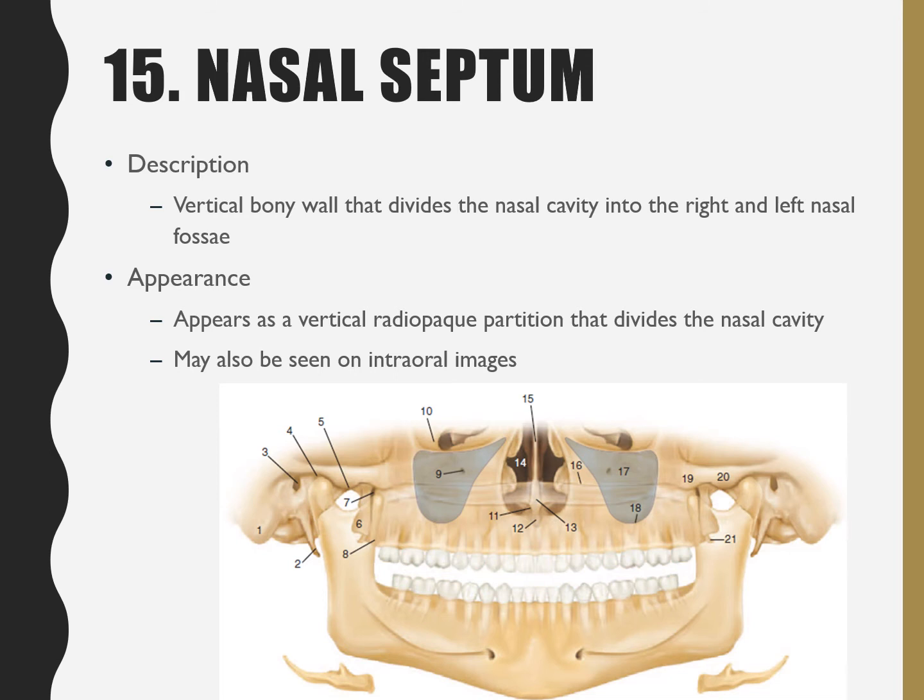Sometimes when you take a panoramic, this nasal septum is not always going to appear perfectly straight, and it might not always divide these perfectly in half.